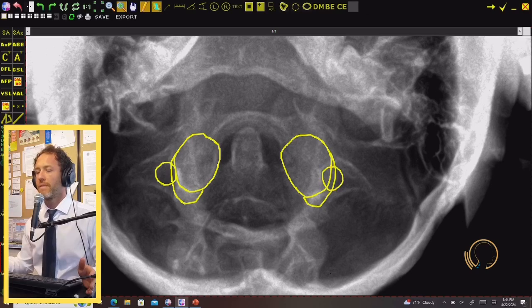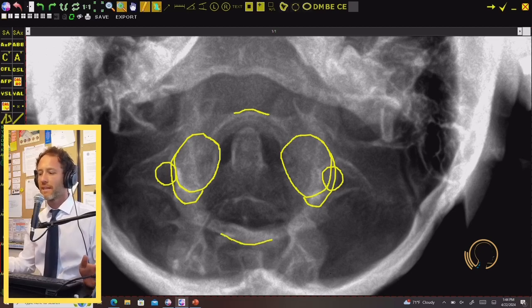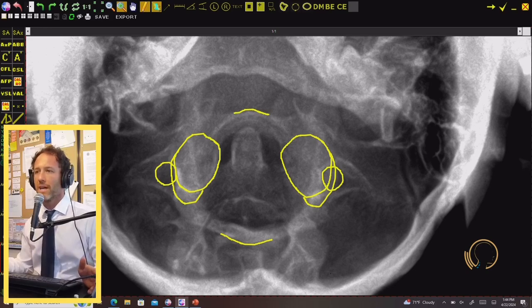All right. And then that anterior and posterior tubercle. What am I talking about? So you'll notice up top here and kind of down south, it's that posterior tubercle. All right, so that's going to give me references to be able to drop some lines. And again, majority rules. So normally my films are not this cluttered. I'm dropping tools and just kind of looking visually.